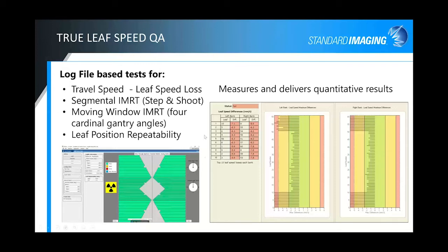And then this component here is just showing you your 10 worst culprits of failure. And obviously, like we've said, for these, you'll see that they're probably the outer leaves in most situations, and you can kind of see that they certainly are, both for the left bank and the right bank.